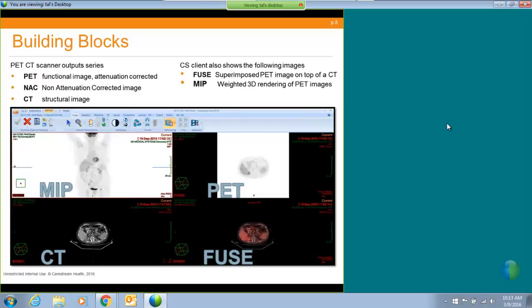And basically what we want is that we only want to see the PET image. This does not mean that we never want to see the NAC image. Sometimes, for people with metal implants, the NAC image is very informative. And so in some cases we would like to watch the non-attenuation corrected image, but in the regular settings we'd like to see the PET only.